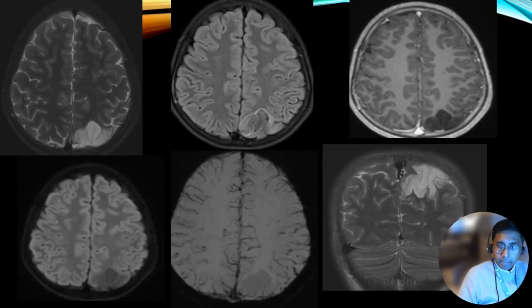This is another typical cortical based tumor responsible for refractory seizures. You can see that this is a left posterior parietal mass which is quite lobulated, and it has a FLAIR hyperintense rim, also called the FLAIR rim sign. There is no post contrast enhancement within the mass, and there are no calcifications at all in the SWI image. If you notice on the T2 weighted image, you can see a sort of wedge shaped appearance. The mass actually tapers towards the lateral ventricle.